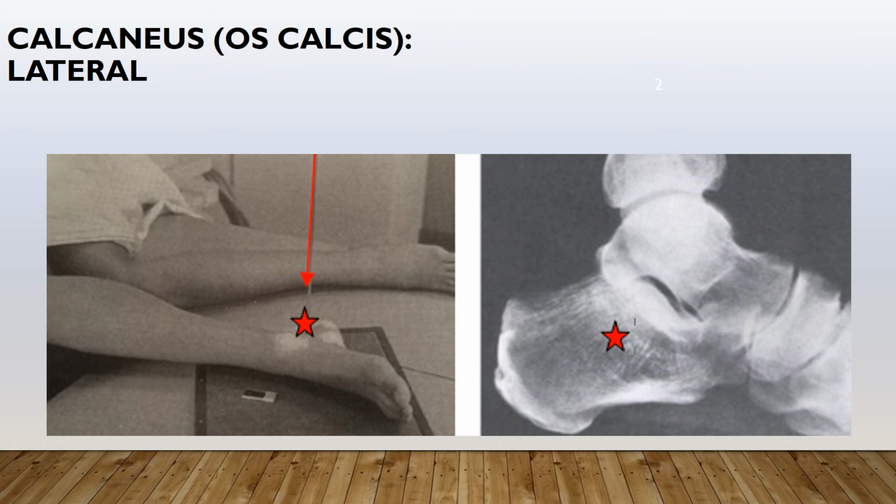When you're evaluating your image, the calcaneus is in profile with the talus to the distal tibia and fibula, partial superimposition of the talus, and open talocalcaneal joint, and there are sharp bony margins and trabeculation clearly demonstrated.